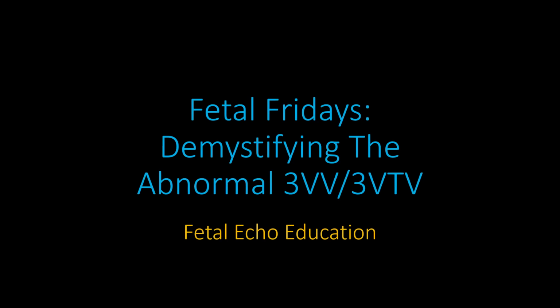Thank you for viewing this presentation entitled Demystifying the Abnormal 3-Vessel and 3-Vessel Tracheal View. The 3-Vessel and 3-Vessel Tracheal View is arguably the most essential component of the fetal cardiac exam, and this presentation will highlight the importance of this view in diagnosing abnormalities with the great arteries, including complex conotruncal malformations, ductal-dependent lesions, and branching abnormalities.